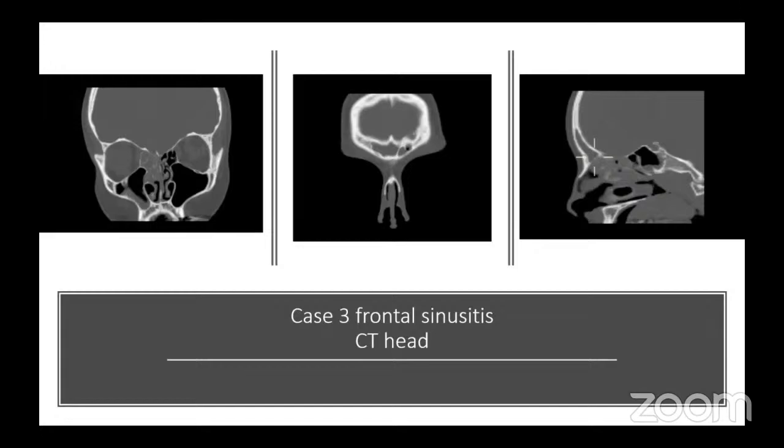This was in the preoperative planning. As you would see, this is the coronal image of the CT scan, the ethmoid sinuses were filled with most likely pus. And you could see the anterior ethmoid canal, which is in line with the skull base, and this is reassuring, less likely to get damaged in endoscopic sinus surgery.